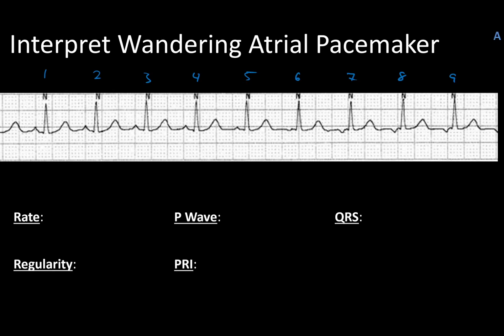Well, does it look regular? Actually, it pretty much does. It might be off by a hair. It's kind of hard to tell. So we're going to just maybe have to get out calipers to figure it out. But let's just go ahead and do the multiplication just to be safe.